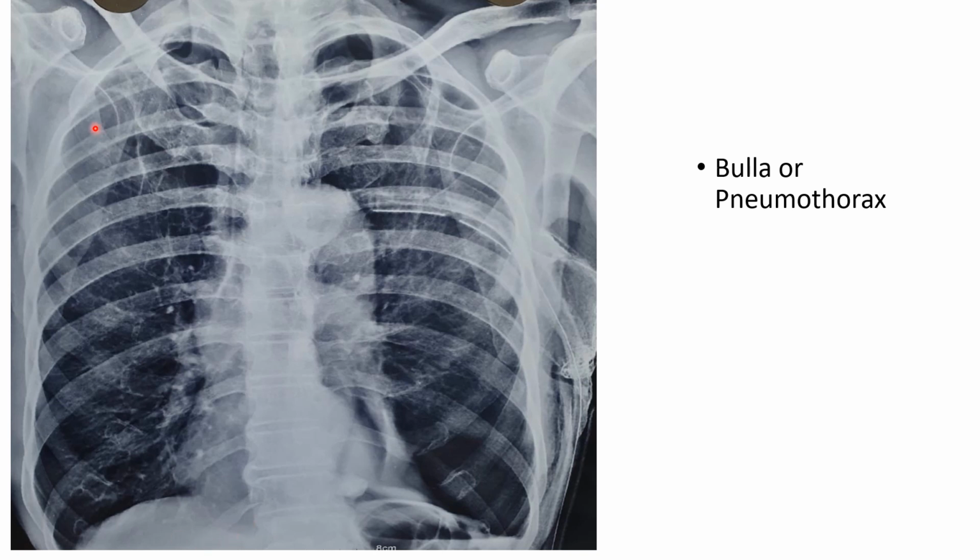So this x-ray suggests emphysema. So hyperinflated. Now in this periphery you are seeing something called a hyperlucent area. So it is a hyperlucent area here, and again you see that there are no bronchovascular markings up here. So hyperlucency with absence of bronchovascular markings. Now the question is whether it is a pneumothorax or not.